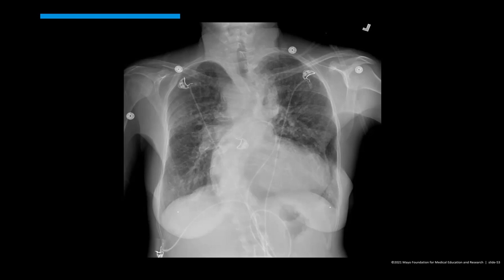If we measured the velocity there, we would have measured a velocity of 3 meters per second, and the normal velocity through the aorta can be up to 1.5 meters per second. So that would have been aortic stenosis. Based on that single image, you can't say anything about regurgitation, but I have some slides a little bit later that will go over that.